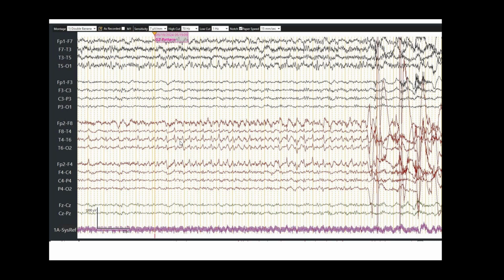As the seizure goes and the excitation gets stronger, it becomes faster. You see higher amplitude because the amplitude, remember, is synchronization. The amplitude means the area of the cortex recruited within the seizure is much larger, and it continues progressively to the point that, once you depolarize, you have to go through the repolarization process, and you have wasted your electrolytes to the point that you do not have enough of them to maintain the seizure.